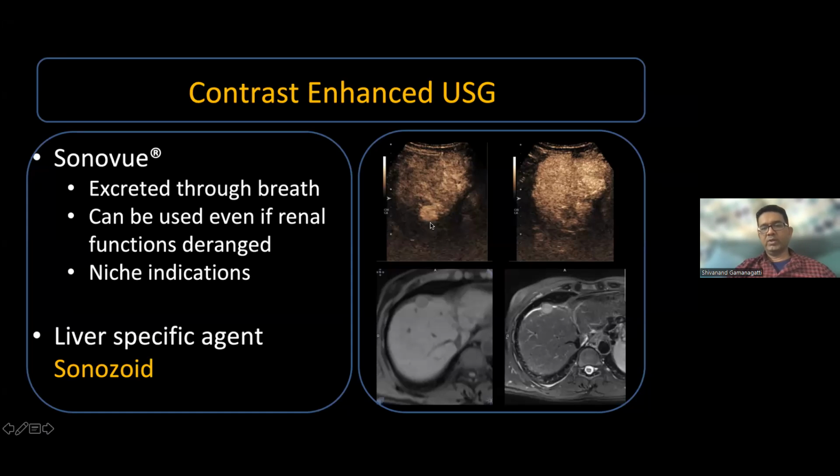Contrast enhanced ultrasound is nothing but microbubbles contained in a phospholipid shell. Once we inject it into the body and press a button, these microbubbles are broken, and wherever there is vascularity, the lesion takes up these microbubbles. So the lesion is hypervascular. In the next phase, the portovenous phase, it shows washout. In a high risk individual, showing enhancement and washout is very suggestive of HCC.